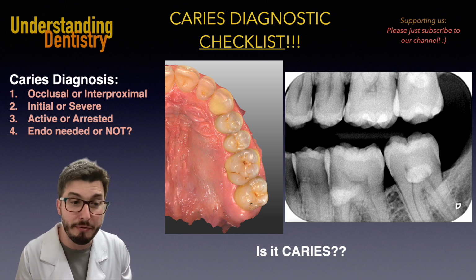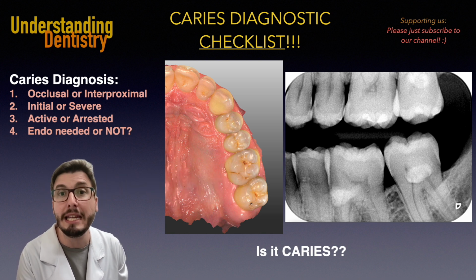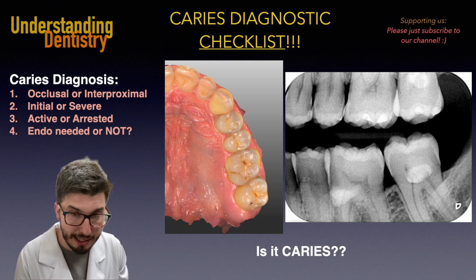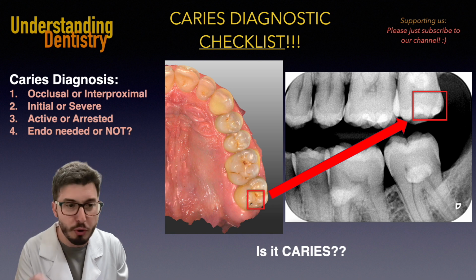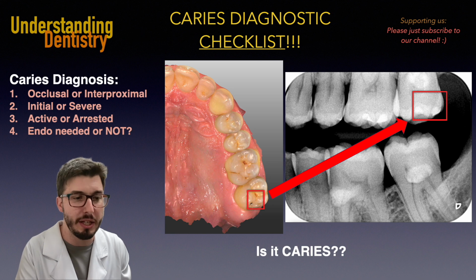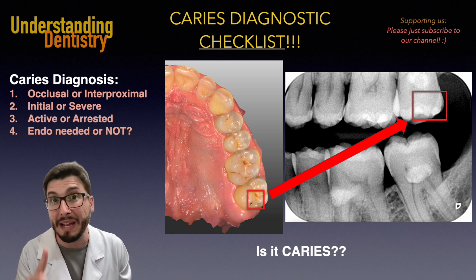But again, we first need to see if there are caries using the ball tip probe, the ICDAS classification, in your clinical intraoral exam. Now I will highlight a situation here for you guys. Take a look, I will highlight in red this situation over here. If it's confirmed that it's caries with the ball tip, so the ball tip gets stuck because it's a cavity, then you will consider that there is caries in this case, and then you use the radiograph to see the extension of these caries, okay? So that's how we plan the treatment of caries.